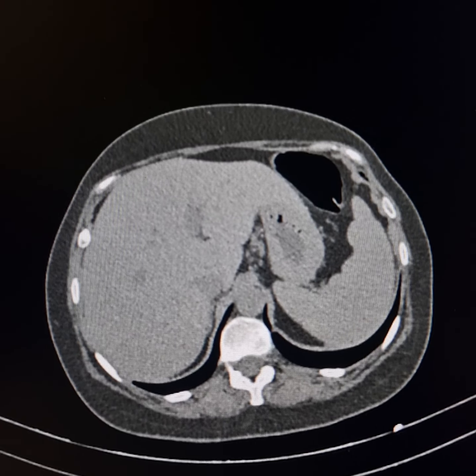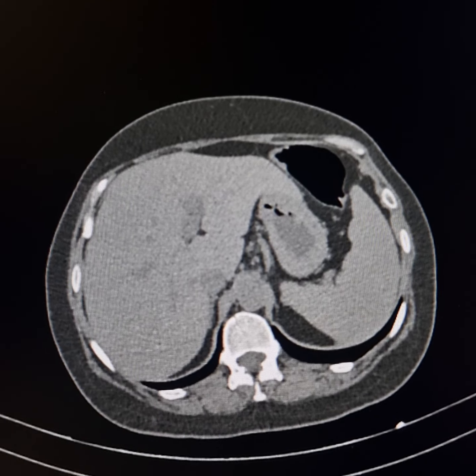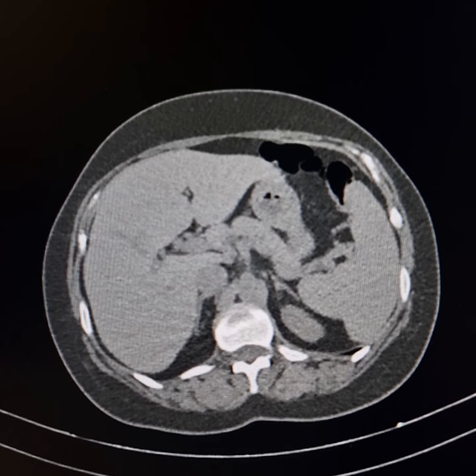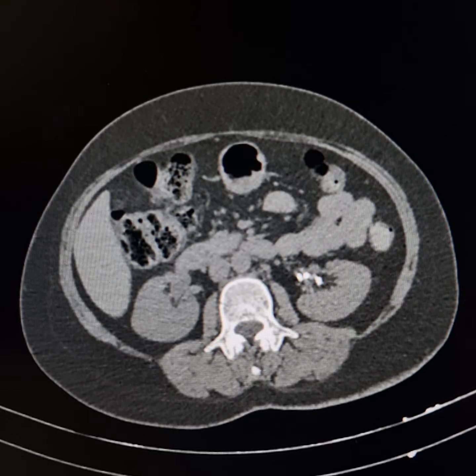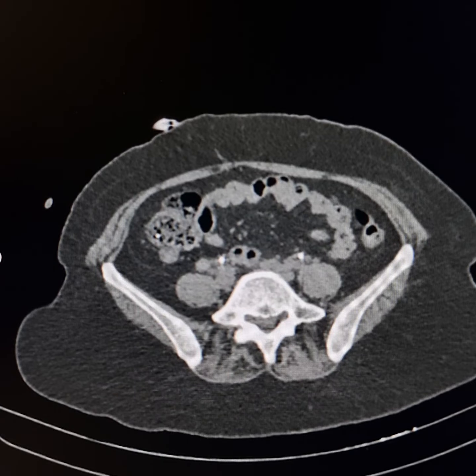This is a plain CT scan abdomen and pelvis of a 45-year-old female patient. Her hysterectomy and bilateral salpingo-oophorectomy was done. Immediately postoperatively, the patient developed fluid collection in the lower abdomen and pelvis.